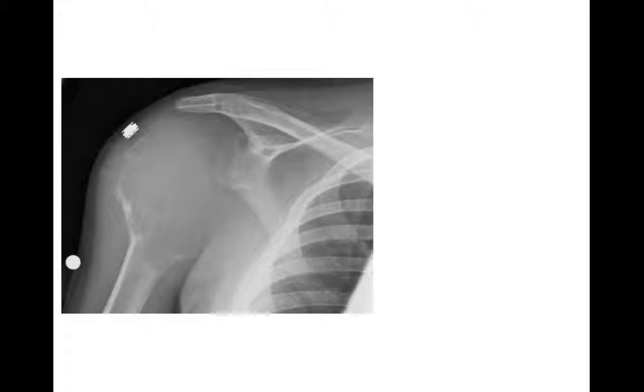Radiograph of the shoulder shows us this geographic expansile lytic lesion with a narrow zone of transition, non-sclerotic border, which is centered in the epiphysis of the proximal humerus. You can see that the cortex is thin. Remarkably, it's almost completely gone here. So we still describe this as a geographic 1B lesion with a narrow zone of transition.